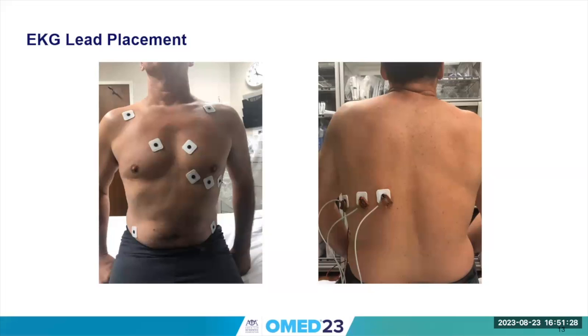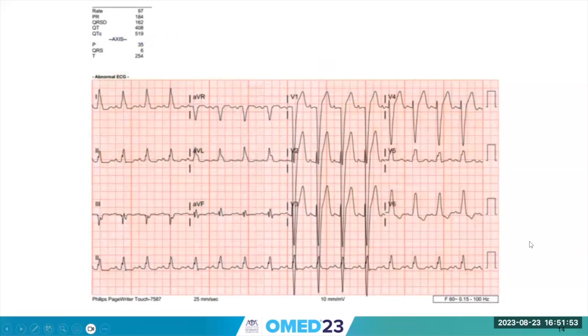And one of the key things with this is the degree of ST elevation seen in V7 to V9 is not usually as exaggerated as the anterior leads would provide. So it's typically modest. So you need to note that even just like 0.5 millimeters of ST elevation may be enough to make the diagnosis of a posterior STEMI. So something to look out for there, folks.